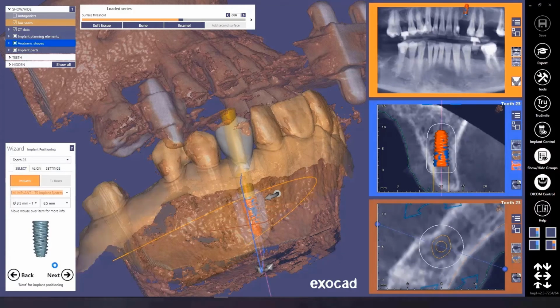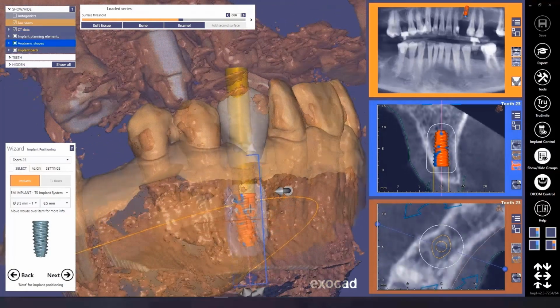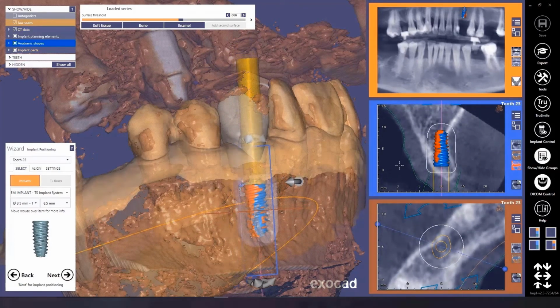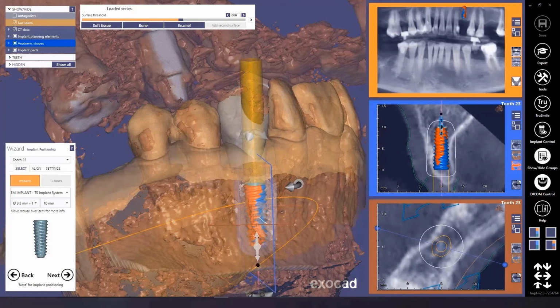According to the specific model and measurements of the implant we are using, we will always have the chance to correct the position and the inclination in order to find the best fitting. As previously said, this planning has to be done and approved by a dentist. Please forgive us if in this demonstration we are not sufficiently accurate from the medical point of view.